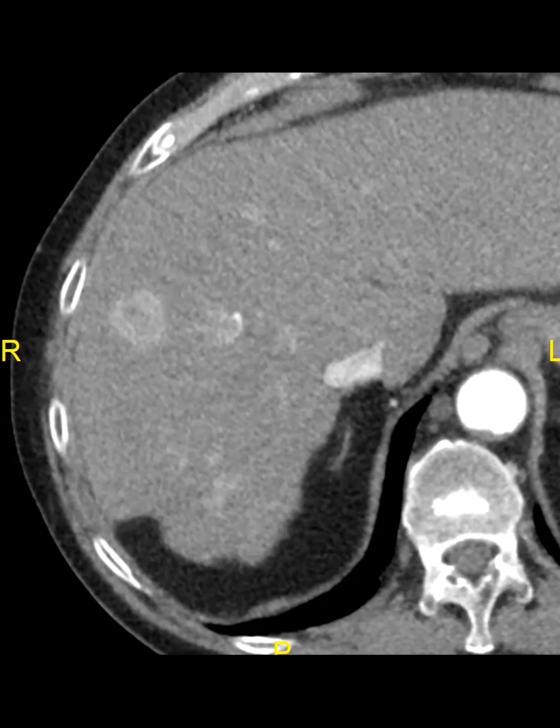So they will have this classic rim-like enhancement in arterial phase, and generally over time the periphery will wash out, and the center of the lesion will retain contrast, particularly in very delayed phases. So you will have rim arterial phase hyperenhancement, peripheral washout, and delayed central hyperenhancement. On diffusion, because the periphery is more cellular, you will see that pattern of increased signal peripherally and not centrally.